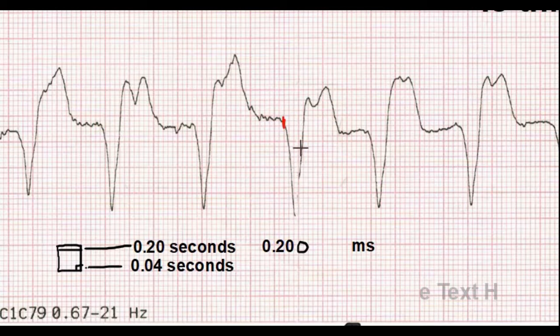Down we have the Q wave, and then the R, and then the S wave ends right around here. If the QRS is greater than or equal to 120 milliseconds, which is 0.120 seconds, but let's talk in milliseconds now, what we do is take a look at the little boxes and count them over.